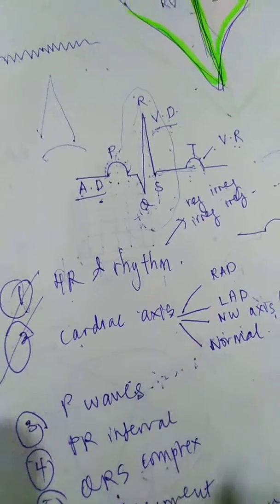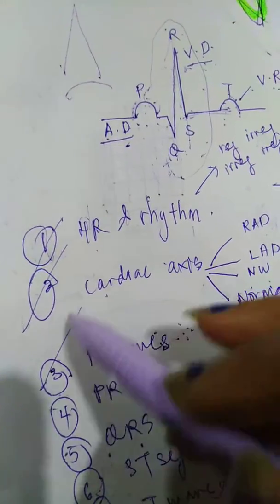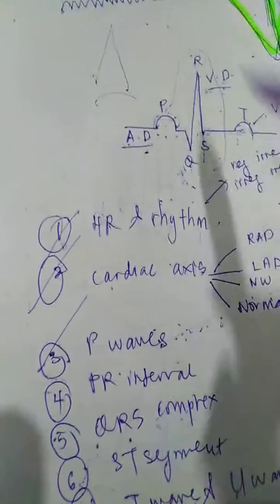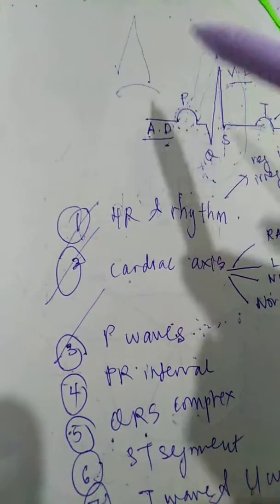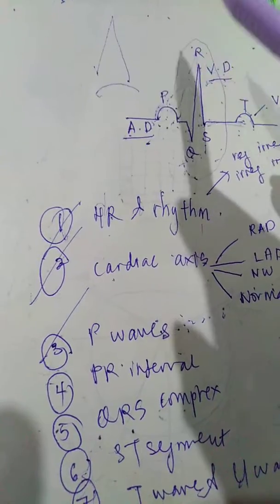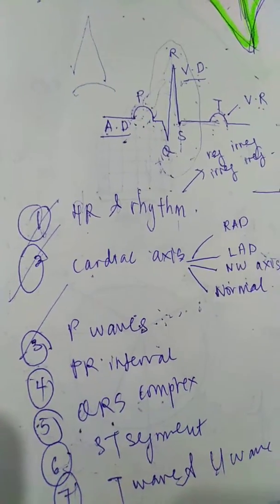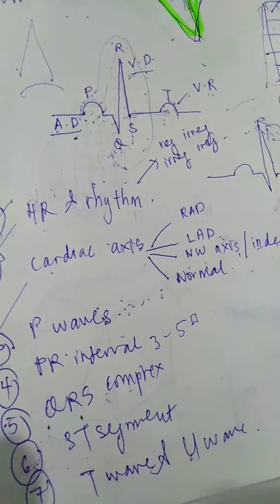Okay, and if they are not present, sometimes you can't even tell if the P waves are present or not. Usually P waves are not present in certain kinds of atrial activity. Each time your atrium contracts, you get this bump. But sometimes when your atrium starts contracting in a very quivering manner, you start seeing flutter waves, or sometimes a sawtooth baseline like this.